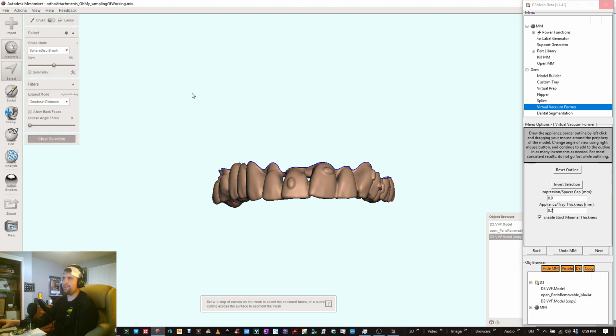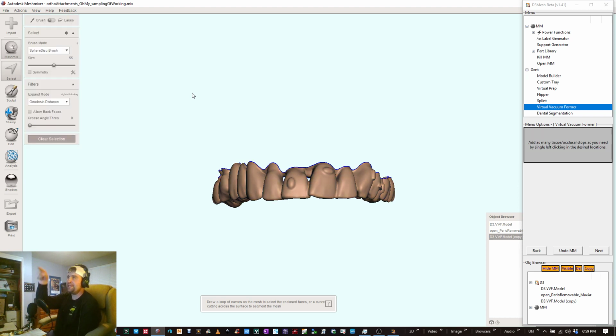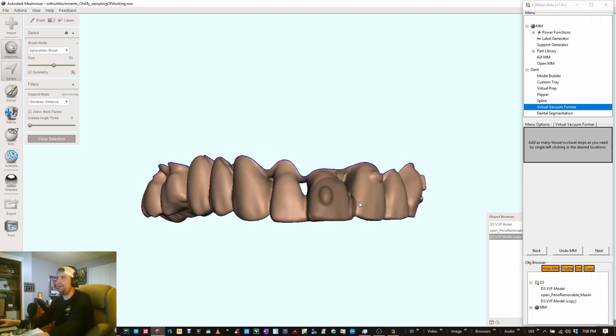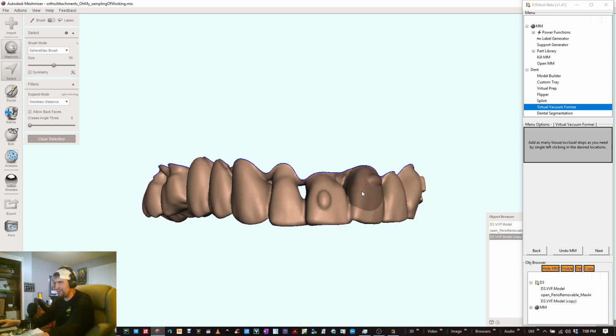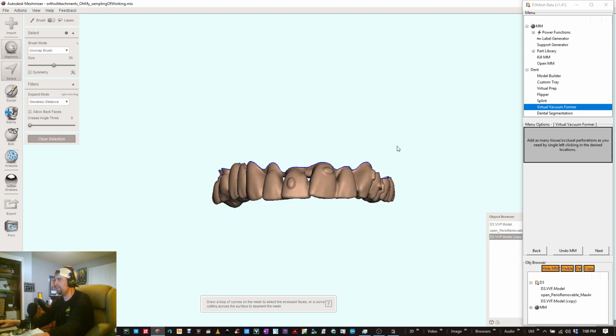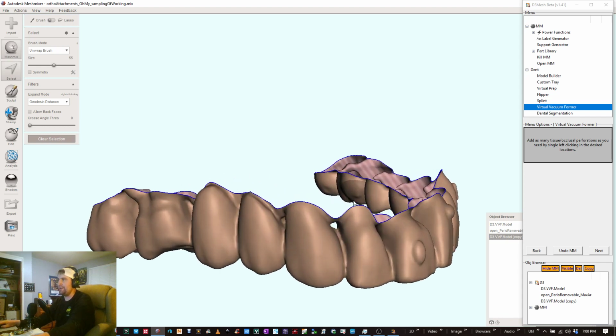Actually, I'm certain this isn't going to work now because I'm looking at those black triangles. That definitely needs to. Well, okay, so this is. Oh gosh. Oh man, I'm getting way too complicated in this. This is not meant for this, but I think there's a fix for it. Okay, stops. We don't need any stops, but perforations. This is where this might come in handy here.